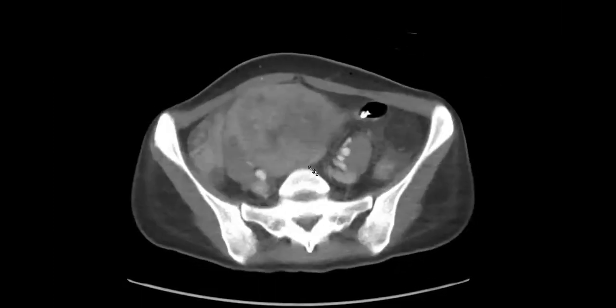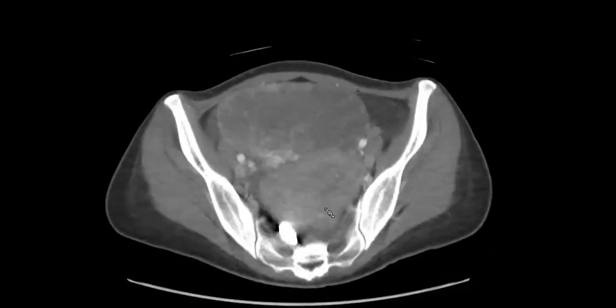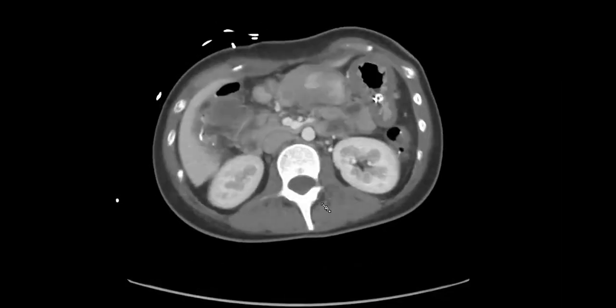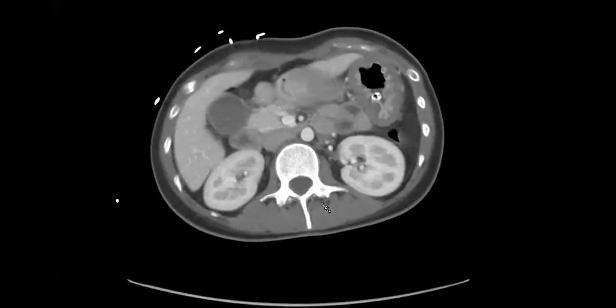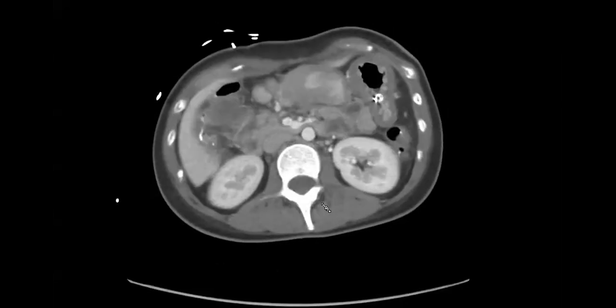So Krukenberg tumor. That's one thing that should be at the top of your differential. So we've got possible Krukenberg tumors of the ovary. And now we're going to look at our places that love to give Krukenberg tumors, which is stomach. Bilateral Krukenbergs? Wow. Well, yeah, Krukenberg is often bilateral. Yikes. Yep. Because it likes to just drop to both of the ovaries.